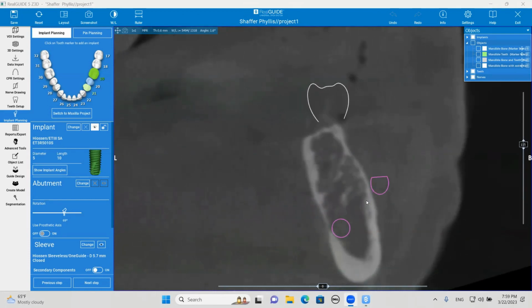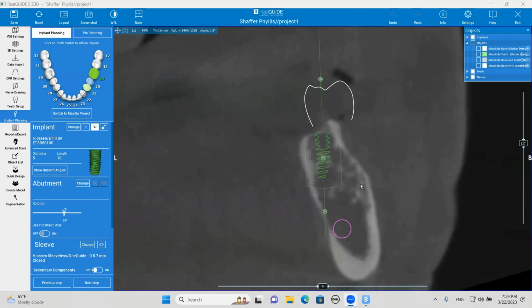The second component of osteoporosis is when you lose the trabecular bone. As you can see, there's very minimal to no trabecular bone. In fact, in this inferior alveolar canal, or mandibular canal, there is no canal. The nerve, artery, and vein, all the fascicles, are just laying there. There's basically no bone around it.